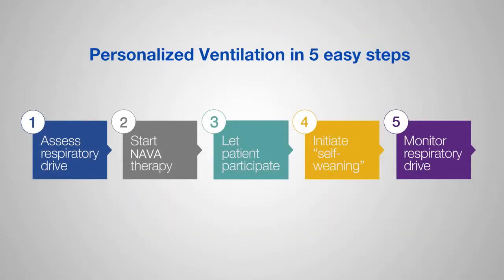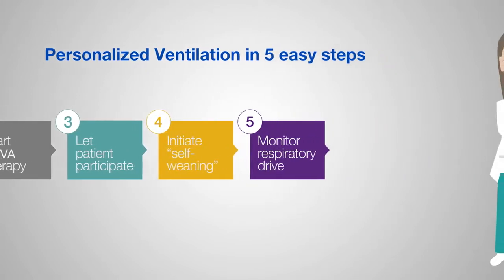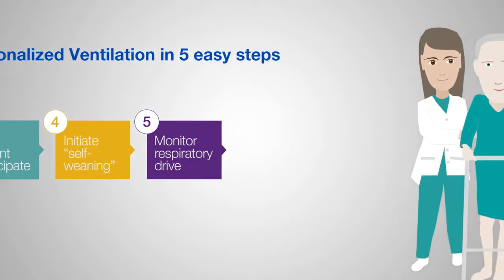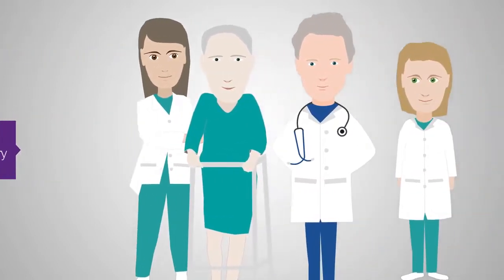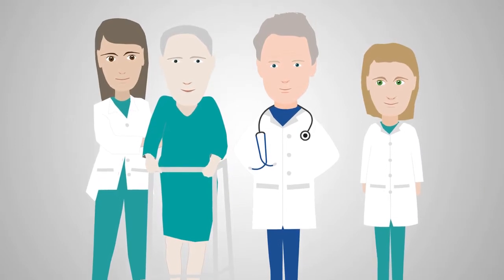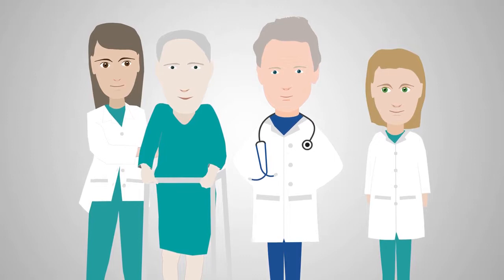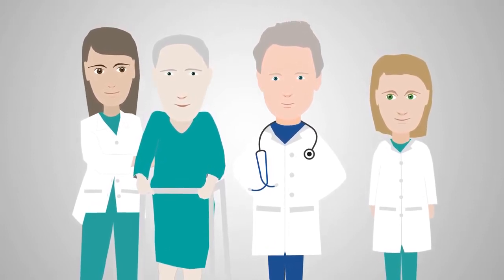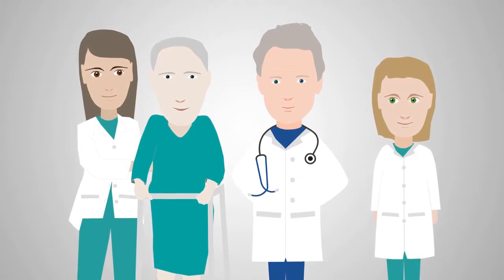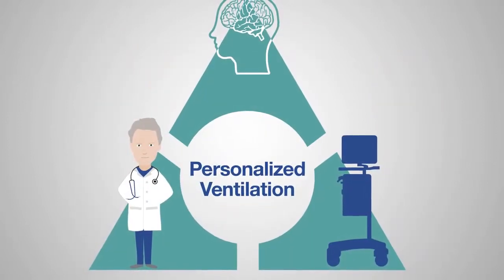With these 5 steps, I have implemented personalized ventilation in routine use. The simple procedure and easy-to-use tools allow my whole team to participate, while mistakes and wrong handling are prevented. Non-invasive NAVA is always my first choice. Should I be forced to intubate, I use invasive NAVA, applying the same simple methodology.